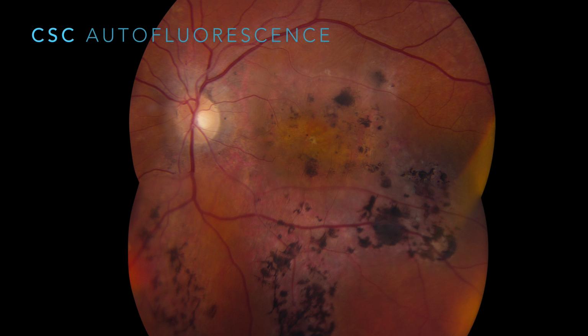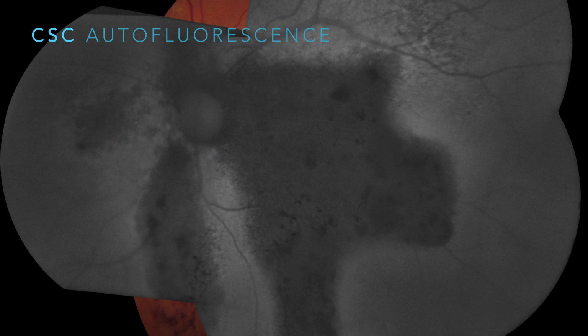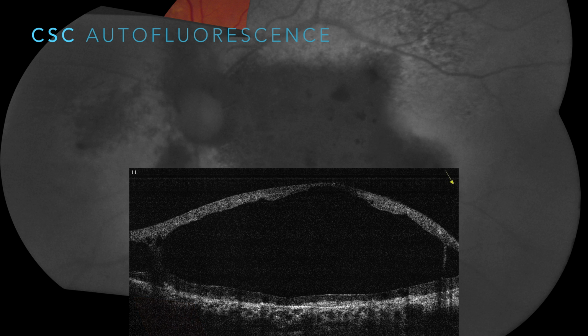This patient has very chronic appearing changes. You see his autofluorescence, his RPE is dead. So a treatment for him is probably not going to make any difference visually. And then if you look at his OCT, he's the only patient I have like this.